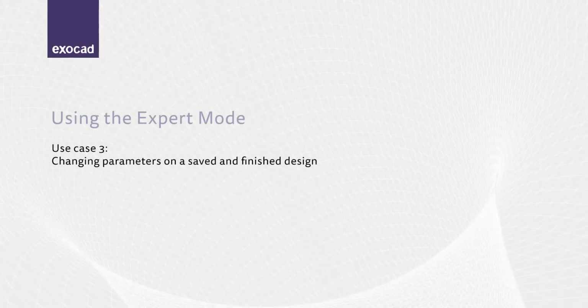The third sample case is a very common example. Imagine you have produced the restoration, but the fit does not meet your expectations. You would now like to change the cement gap settings and maybe the insertion direction for a saved case.